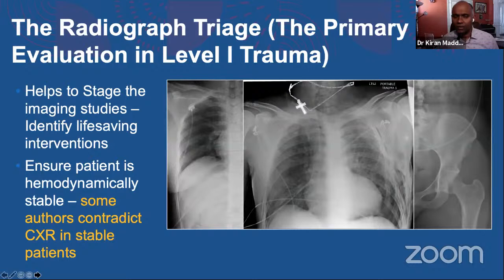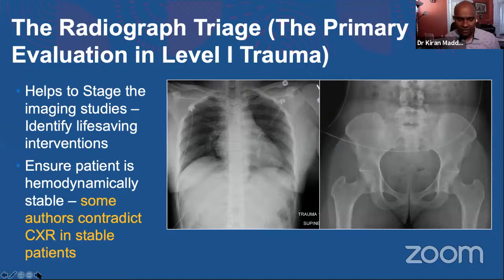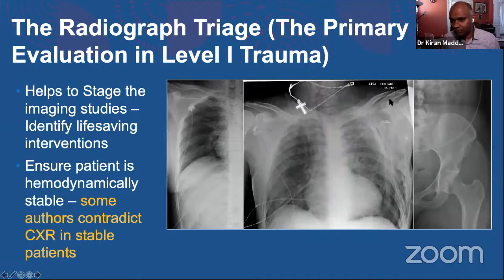The examples which I showed there are absolutely unremarkable, but at the same time, there is a positive case here, which is a case example for you. And I think one of the cases also, I have included this as one of the case presentations here. So again, come back to here. The medical students should be very careful why this case says portable, why this case says trauma, because it comes with some limitations. So this is a chest radiograph in a motor vehicle collision. I'll come back to the findings when I start describing each case and my checklist.